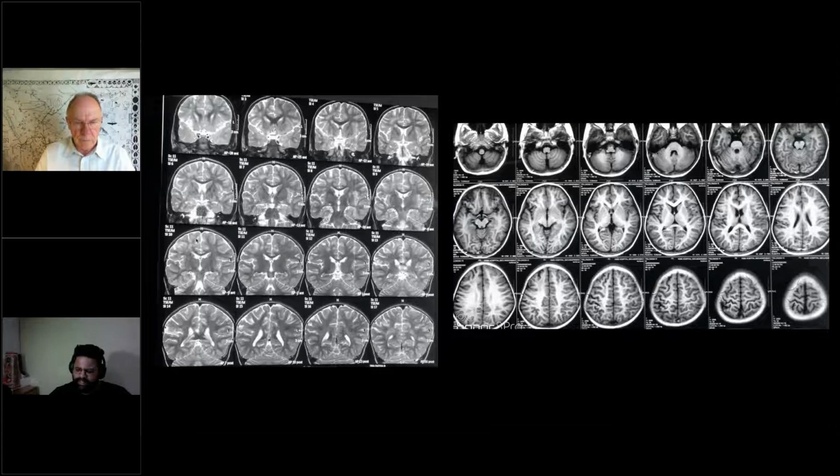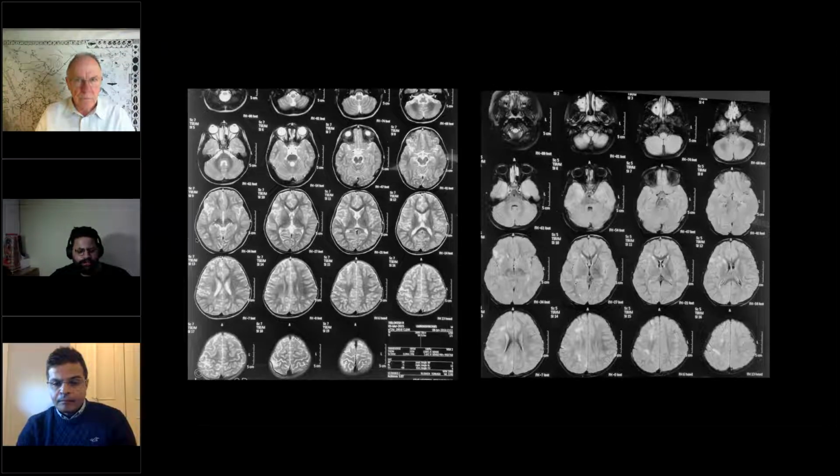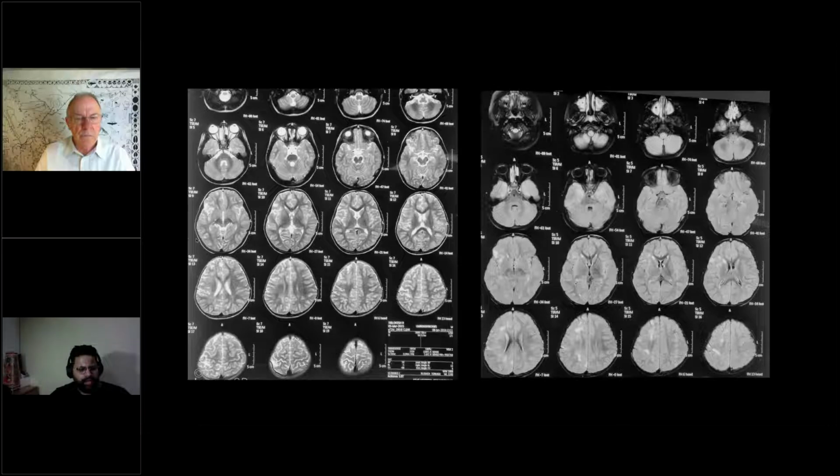I don't know what Dr. Mankad or anyone else would think, but I would not think that these are changes related to hypoxia or hypotension, at least in the neonatal age group. Whether we're dealing with a demyelination or an infection was the doubt on the images. And the atrophy: if the patient has right focal epilepsy, whether it is related to the epileptic discharges or not was the question.